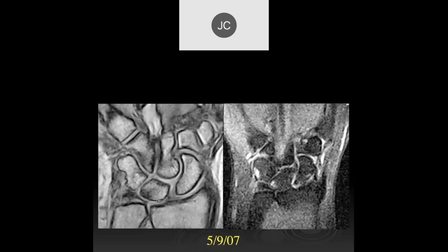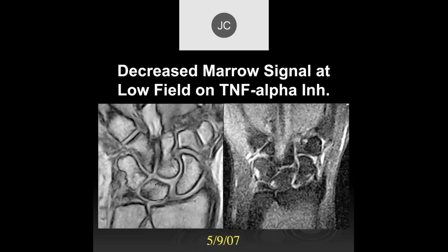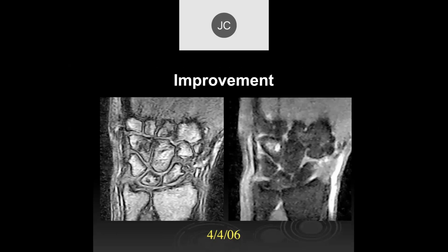Right. So this is basically, again, after putting on treatment, in this case with a TNF-alpha inhibitor, you can see that it's allowed healing. We've gotten rid of most of the inflammatory disease, and then it's healed as much as it can. But again, there are areas where you have irreversible damage that you're not going to get back with medication alone.